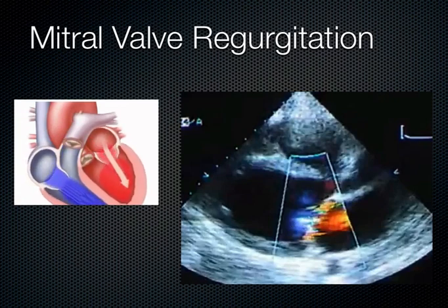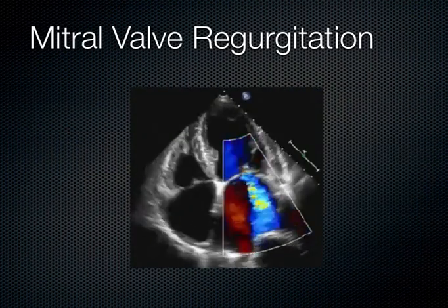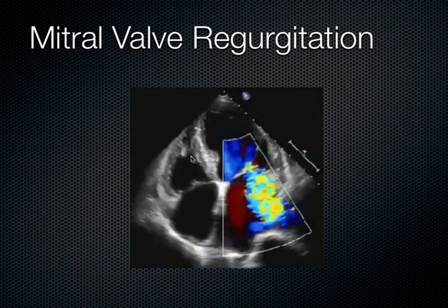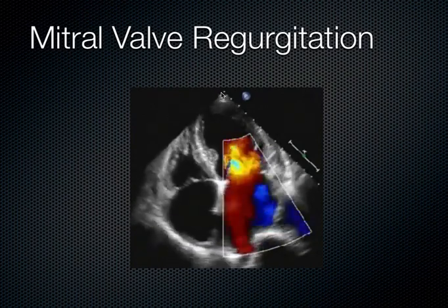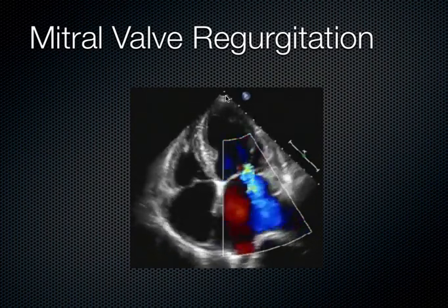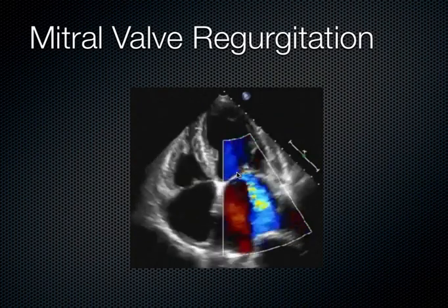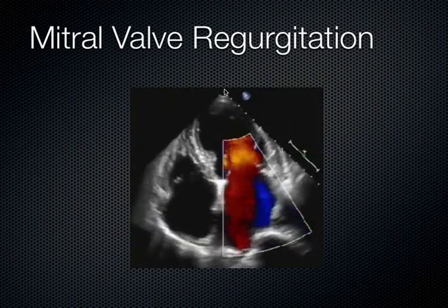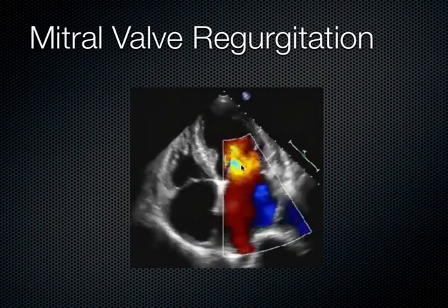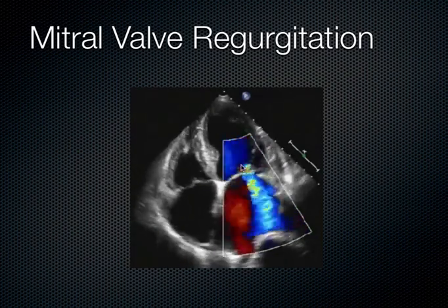Instead, a healthy mitral valve keeps your blood moving in the right direction. A leaky valve, I'll show you what I mean here. This is the apical four-chamber view, and we see the LV is here, the RV is here, and the way the sound is aiming, think about the probe throwing the sound down the barrel of a gun. What I mean by that is the flow is now coming directly towards the probe, more parallel to the sound rather than perpendicular, and that gives you a much more accurate assessment of what's happening with that valve in terms of color flow.